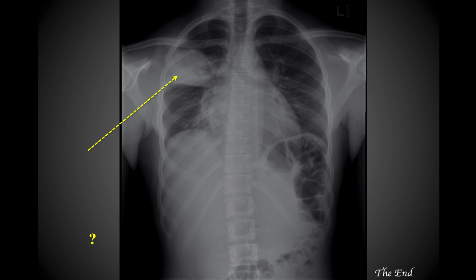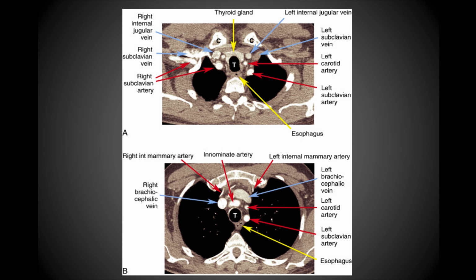And then once again, looking at this image, make sure that you're able to correctly identify the different lobes of the lung, since that's how we'll ask questions about that on future quizzes as well. And then this is just foreshadowing some of the content coming at you on Thursday as well as next week. You'll be learning how to identify what structure is pointed out by the arrow in this image.